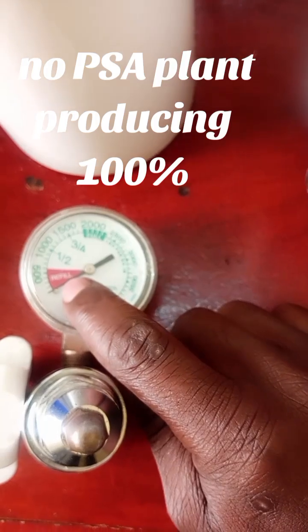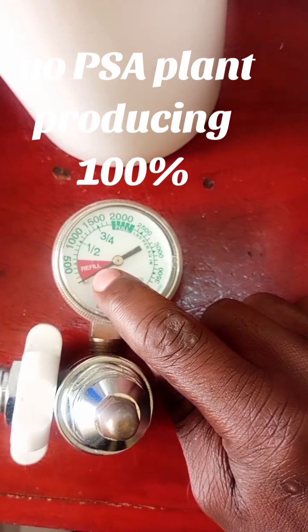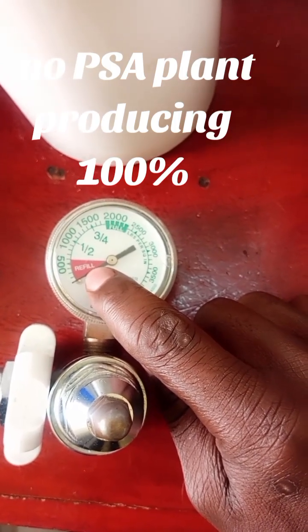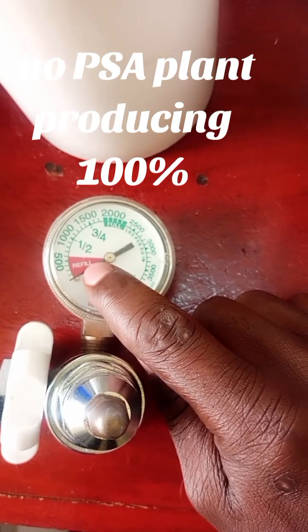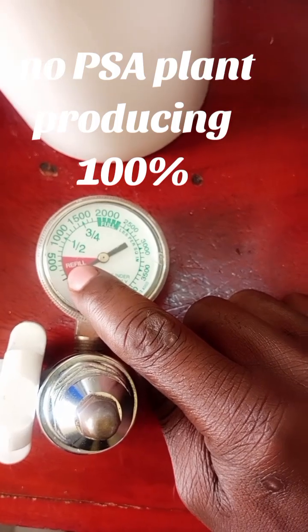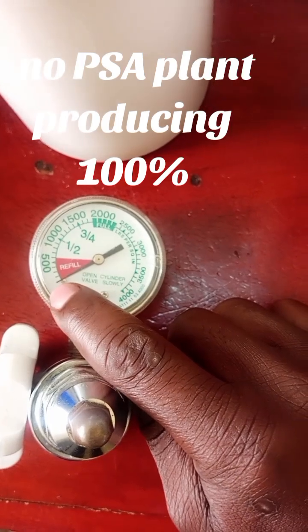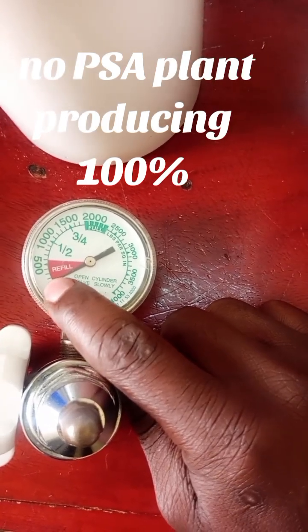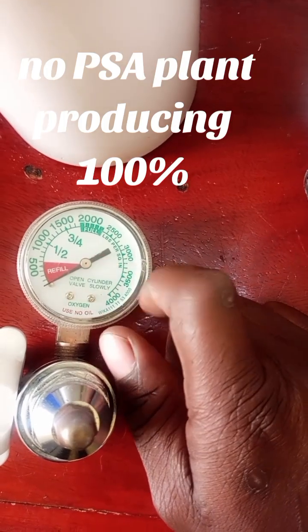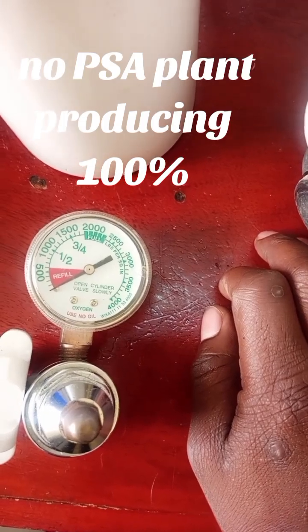But when you are using this oxygen gas cylinder and the arrow drops near this red zone, where red is refill, you are not allowed to use it down to the 0 point. You need to go to the oxygen plant to refill the oxygen gas cylinder.